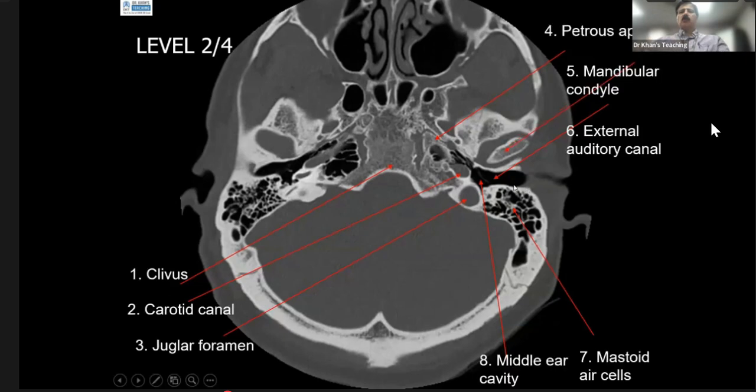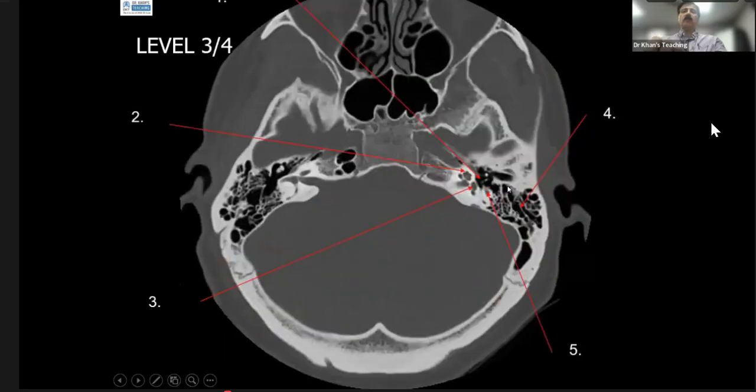So this, if you see carefully, is the tympanic membrane. So this is the middle ear cavity. We are just able to see it. Now, if you see here, this mandibular condyle should be part of your protocol when you see a CT of head trauma. Many a time it has come in the exam, they will show you an axial CT and the mandibular condyle is not sitting in this fossa. So there will be dislocation. On an axial CT, very easy to miss. So this should be part of your protocol.